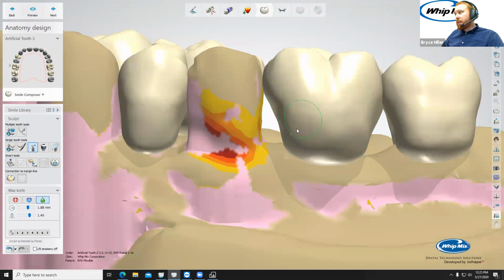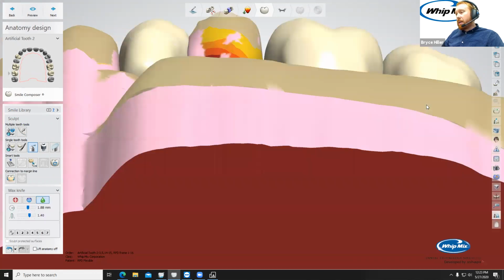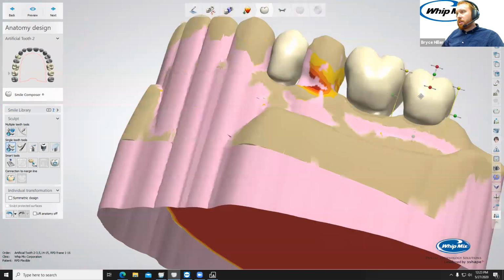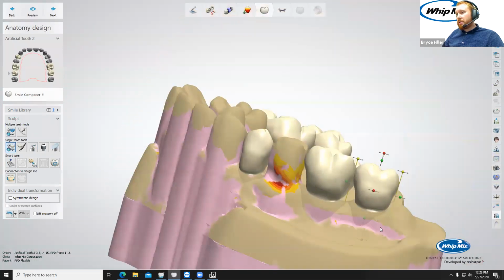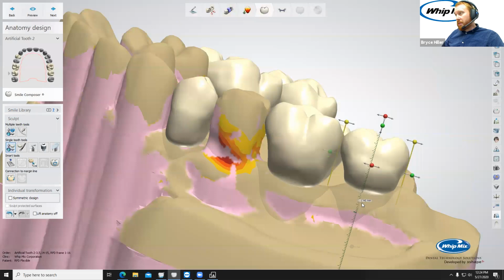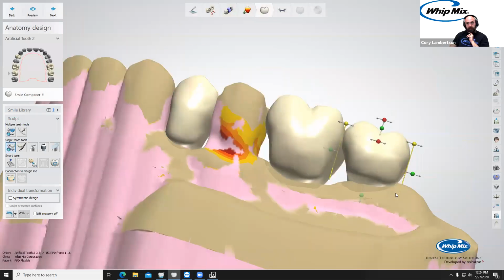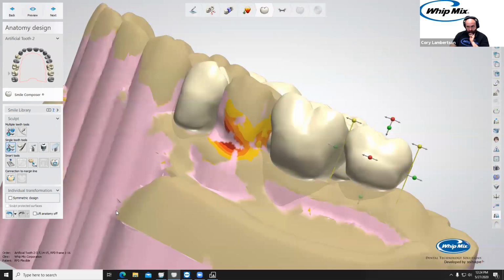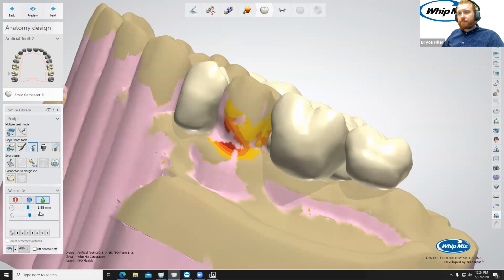There's probably something in the algorithm that analyzes certain heights or something. It didn't do it on our second molars. It didn't adjust those interproximals. It's hard telling. Anywhere that's touching the scan, it's going to. Yeah.